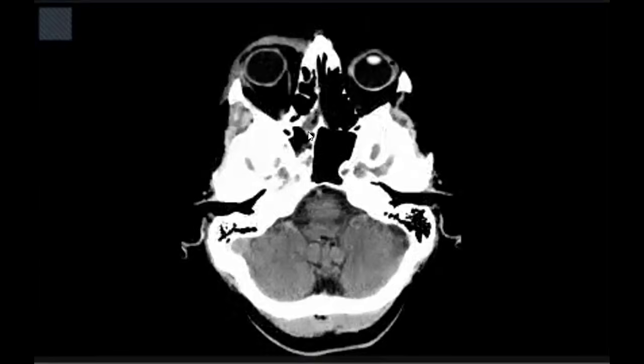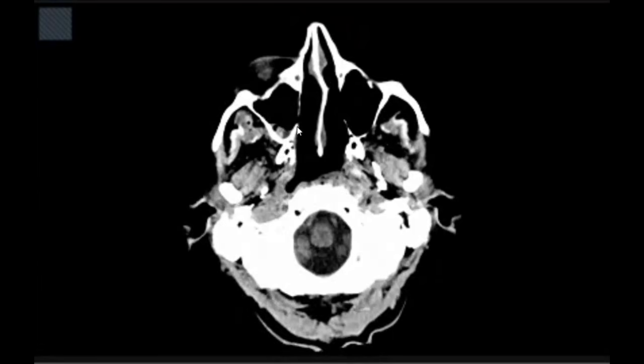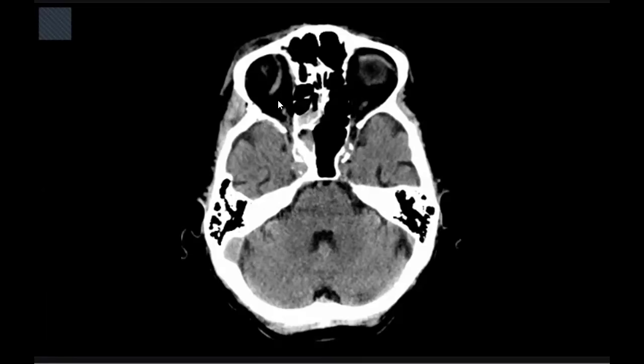There is hemosinus seen in the right sphenoid and the right maxillary. So something is happening here. At this time, concentrate on this area. I'm looking at the orbit well, go up. The ophthalmic vein is very important because this patient is 75 years old, a very old patient.